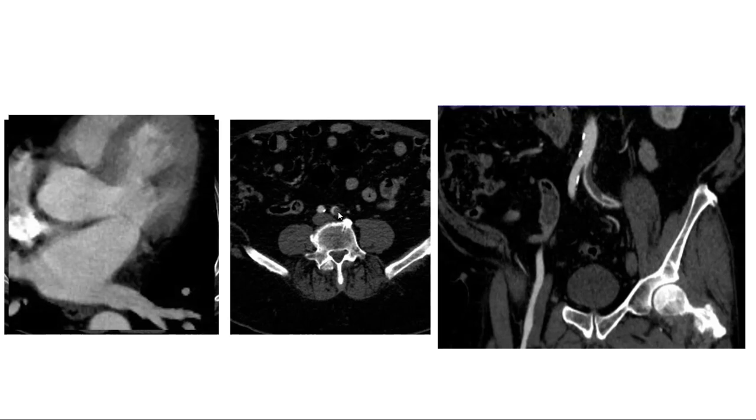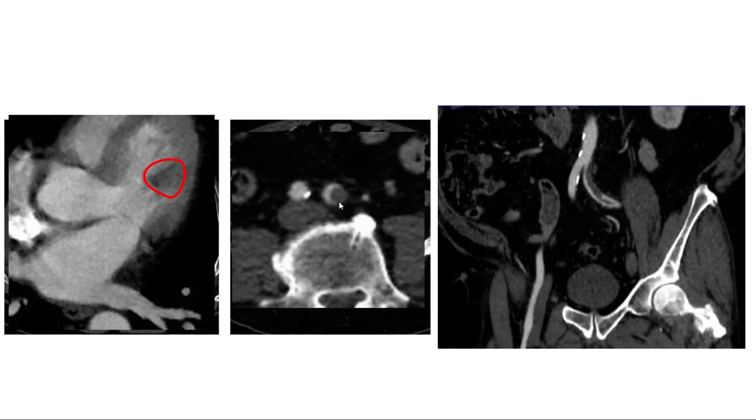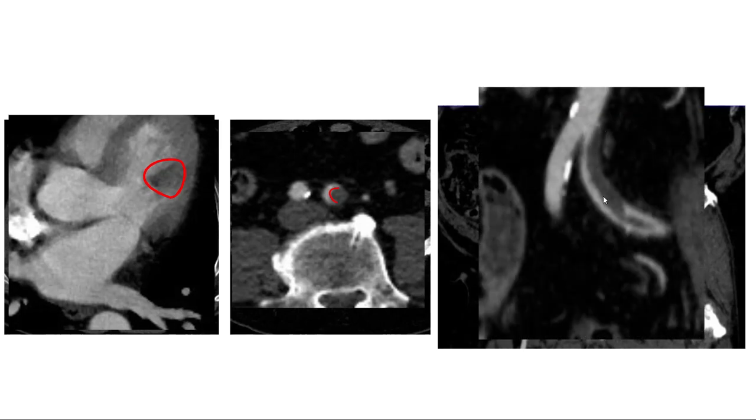And then we're seeing this sort of waning crescent moon with this peripheral plaque or peripheral thrombus. This just doesn't look normal on axial imaging, and it has this kind of weird meniscal shape to it. This isn't quite the meniscus sign, but this just isn't a normal shape. And then when we move to the coronal reformat, we're seeing this irregular plaque that's just sort of floating in the breeze here. Again, very abnormal. Chronic plaque does not look like this, unless there's been a recent intervention and we've dissected some of that plaque. But this reminds me of a windsock with this little bit just ready to fly down and find a new home.